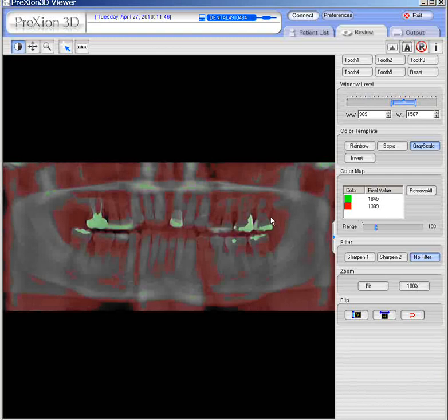And so again, you can also click into the field of view and change colors that way if you wish to add, or you can remove them all just by clicking remove all. And you remove all and you go back to your original setting, which most people like anyway.